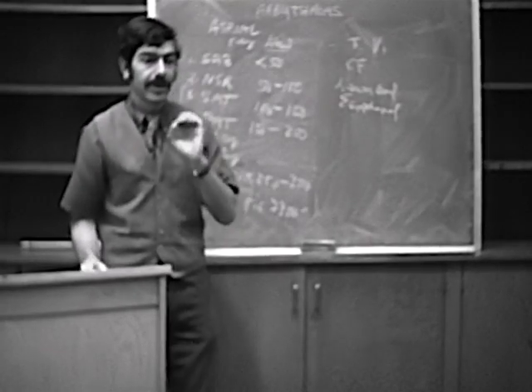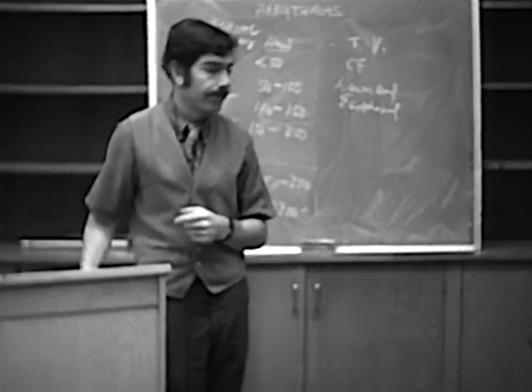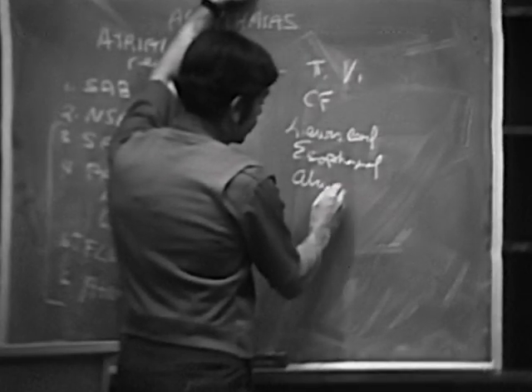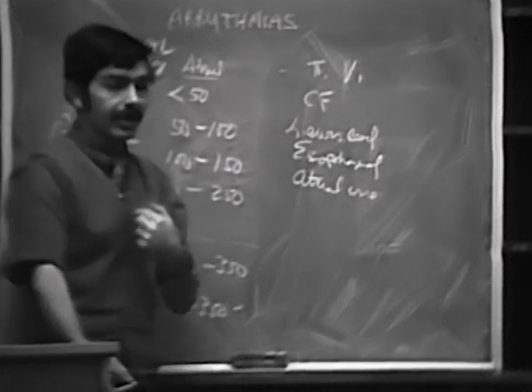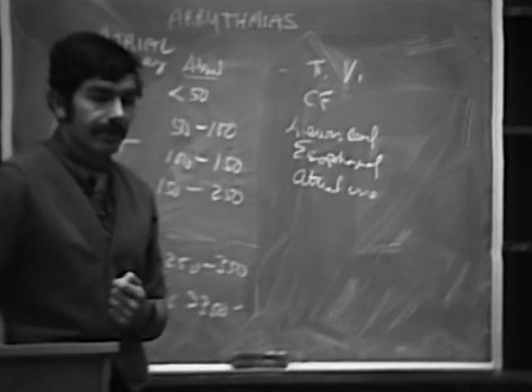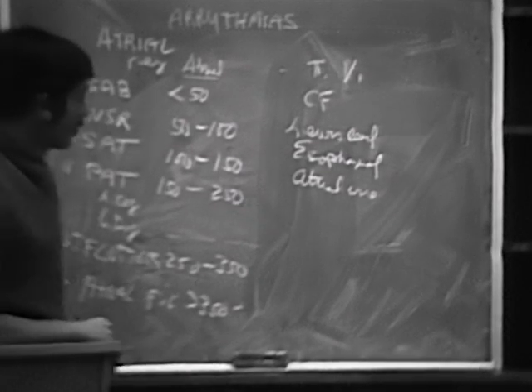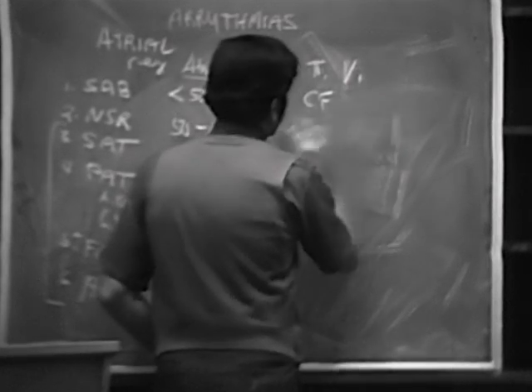On this, it's like an NG tube. You put it down behind the heart, at the level of the atrium, and you pick up very nice P waves. And then also, finally, you can put in an atrial wire. Wire up the vein and into the right heart. It's like a CVP line. Right? And you can record very nice P waves that way, and then see what their relationship is to the QRS. Okay, so these are different ways of looking at P waves, which can be helpful.